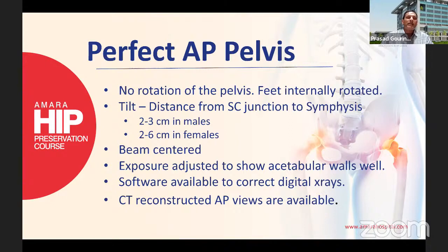Then you want the beam centered so that both hips can be seen equally well. And the exposure should show the acetabular walls well. That means the anterior wall and the posterior wall of the acetabulum should be clearly visible on that X-ray.